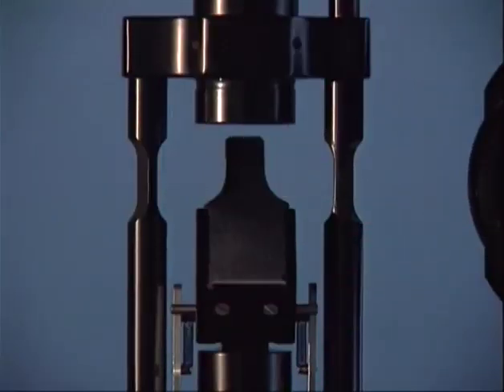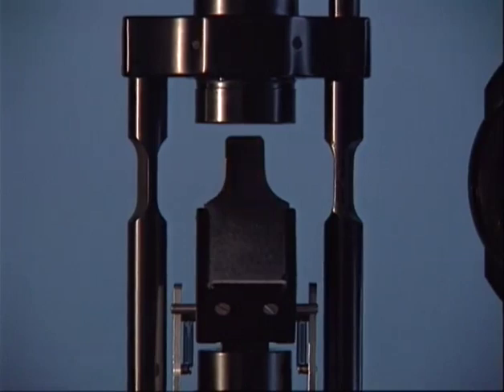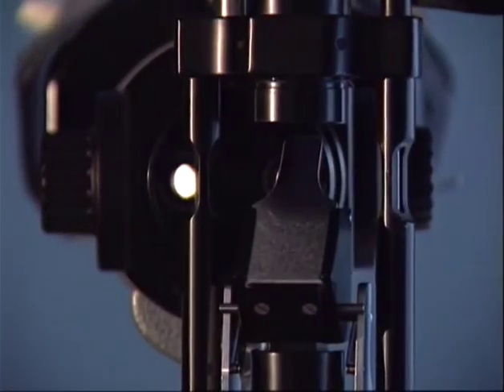This is the mirror for directing the light from the light source towards the eye. The slit light is directed into the eye through the superior extension of the mirror. As shown at the microscope with the lenses illuminated for demonstration purposes, the long mirror may obstruct binocular vision at small illumination angles.